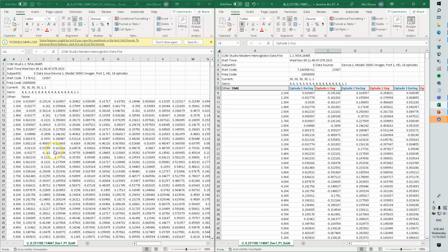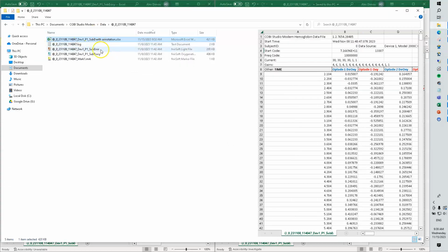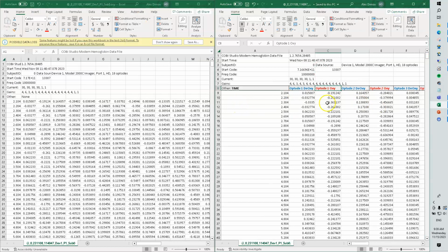So knowing this, you can use the data in your workflow if that involves something other than the fNIRS software for analysis. Similar to this, you also have access to the raw light intensity data, as I mentioned, and that's in the .NIR file. But the oxy file makes things a little bit easier for you because the data are already processed to give you oxygenated and deoxygenated hemoglobin.